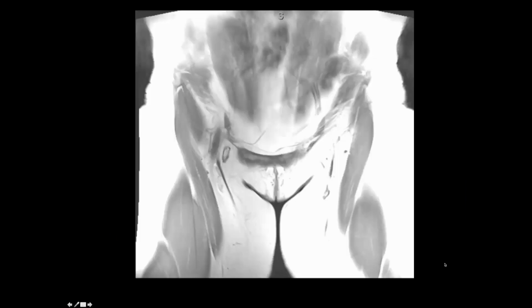These are large field of view coronal T1 weighted images through the pelvis, and we see these muscles traveling from proximal to distal in a lateral to medial direction, and these are the sartorius muscles. The sartorius will originate at the anterior superior iliac spine together with the iliotibial band, and then will travel from lateral to medial to insert onto the medial aspect of the proximal tibia in the region of the pes anserinus.